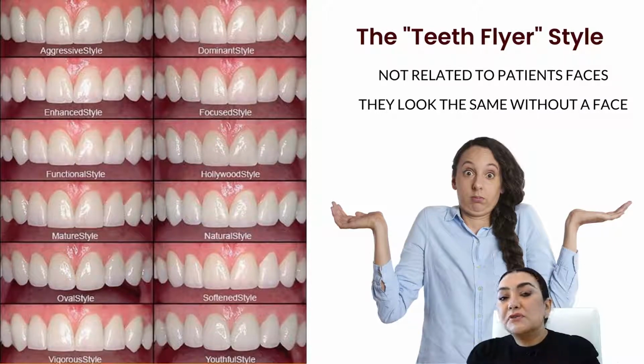And this is one of the first benefits that we get with SmileFy. When you do the smile simulation, you have the library with different templates that allows us to do multiple combinations and also show us different smiles that we can provide to our patients. So I would say the impact of the flyer is not as strong as it was in the past.